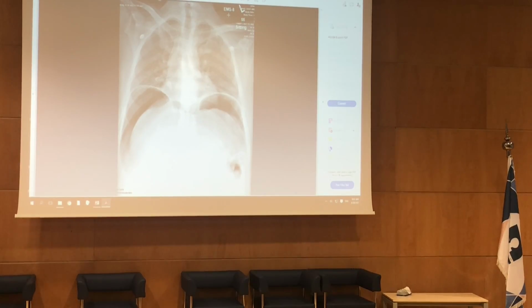Bowel, it could be bowel perforation, it could be post-surgery. When you do abdominal surgery, there is some air within the abdomen, and you see it, and you report it, but it's acceptable. So yeah, it could be either, or it could be a perforated ulcer, any cause of pneumoperitoneum.